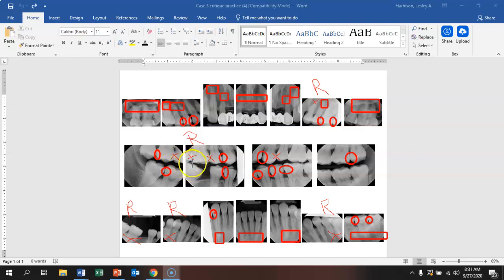I do think these molar contacts are absolutely closed. And then you could focus more on that. And we could say this is open enough, but that still constitutes a retake. So we're still at really 5. Truly, we're at 5. So 5 retakes is a lot of retakes for a patient who just had a full FMX, but it's allowed and it happens, and we are in a learning environment.